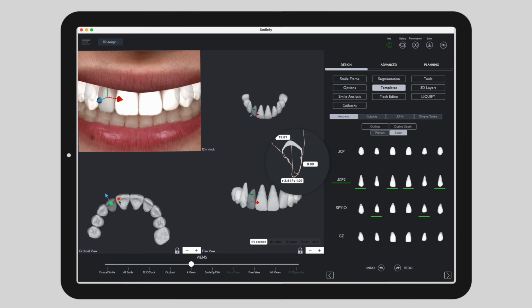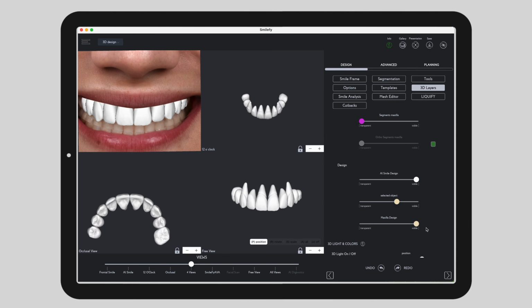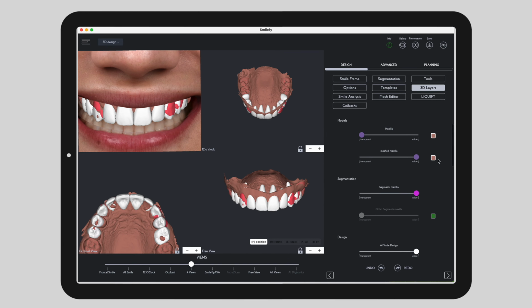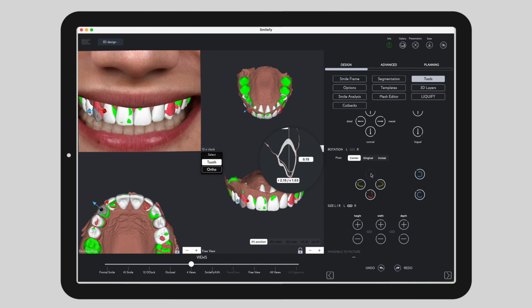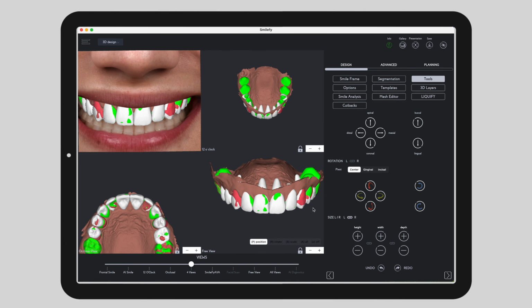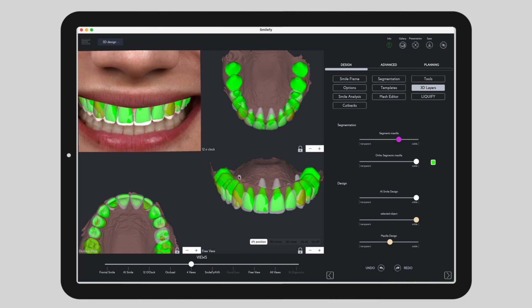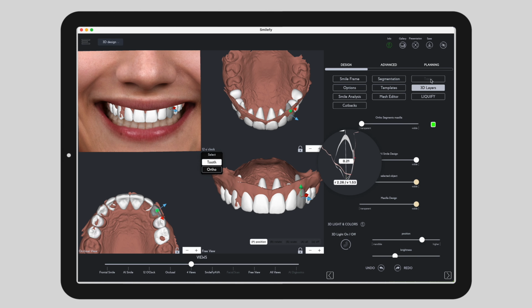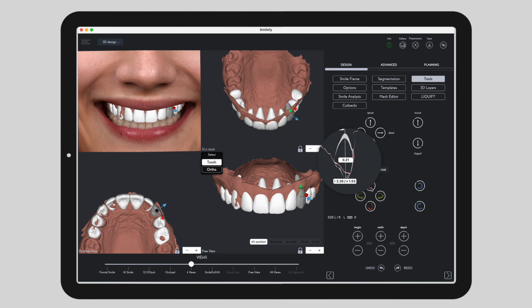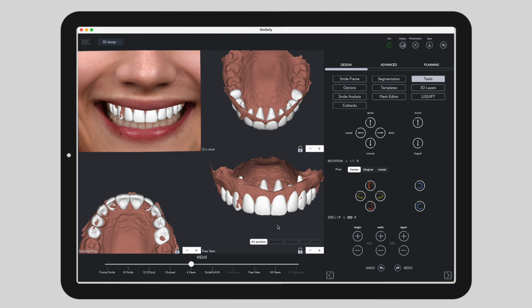Through this streamlined process, you can align and position teeth orthodontically, correct axial angulations for minimally invasive preparation, refine gingival architecture for ideal aesthetic framing, and match the 3D model precisely to the facially driven AI smile design. The result is a highly accurate, interdisciplinary digital plan that supports the creation of the best possible aesthetic outcome for your patient.